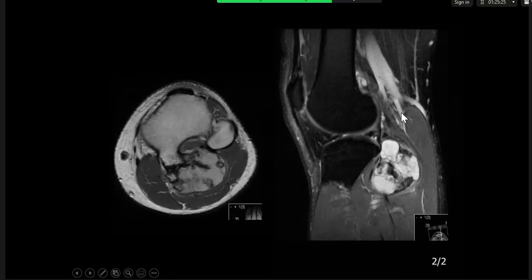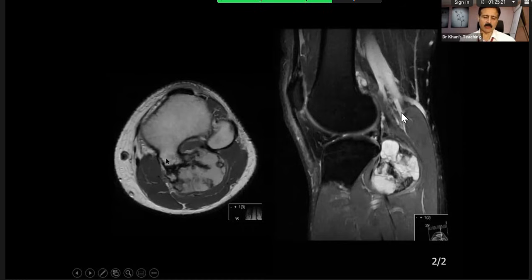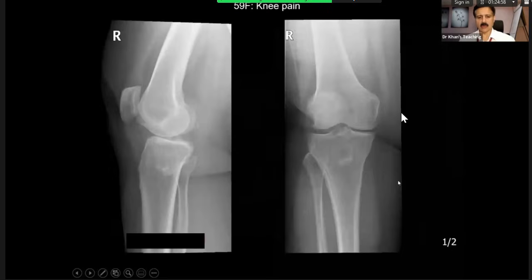orthopedic unit. Okay, fine. If you see, this is the bony part, and then this is the cartilage cap. You don't have to measure it. It is definitely more than 2.5. Cartilage on a T2 weighted sequence or a PD weighted sequence appears as high signal. And if there is some calcification, which is the chondroid matrix, that will be low signal. So this is potentially malignant.